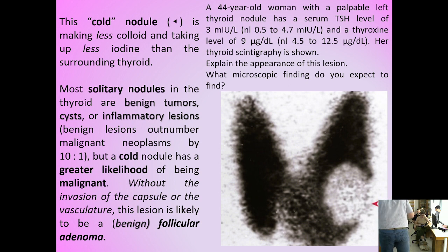This is follicular adenoma. In papillary lesions, only malignant lesions are papillary. Follicular lesions can be either benign adenomas or malignant follicular carcinomas.